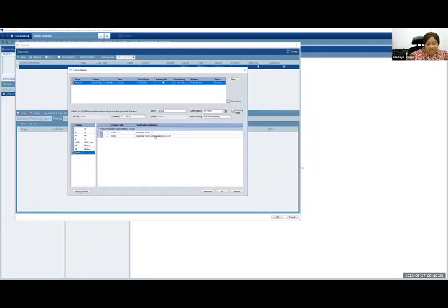And then the Oncotype DX is usually what, so many people stage and stop here because we don't have Oncotype DX. And then the stage is going to continue to show as the stage X. So if you have it, select it. If you don't have it, go to score not evaluated. Now, I selected HER2 equivocal because I wanted to show what happens once you don't complete every aspect of 8th edition staging. The system is not going to be able to stage the patient for you. If I change this to HER2 positive, it's going to stage it to 3B instantly. If I selected HER2 negative, 3C. But if I go to equivocal, it goes back to a stage X.